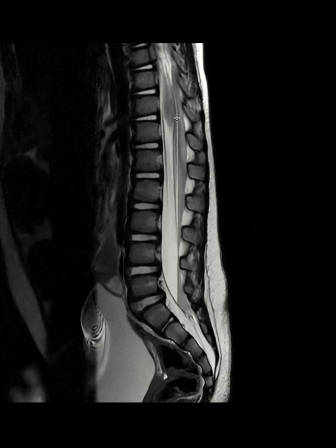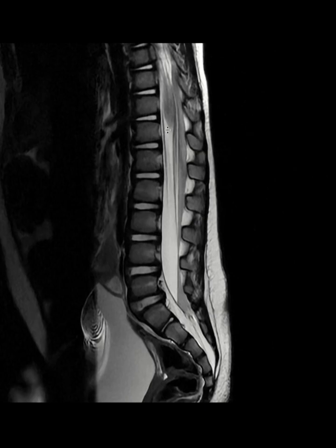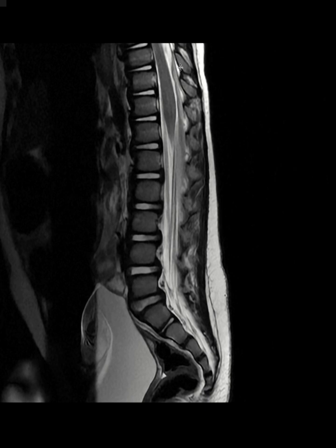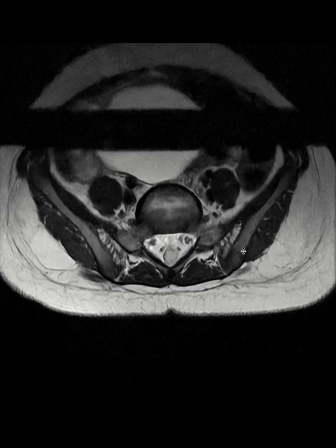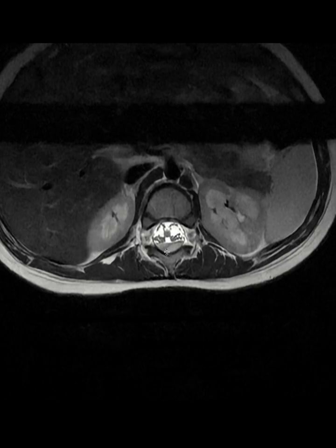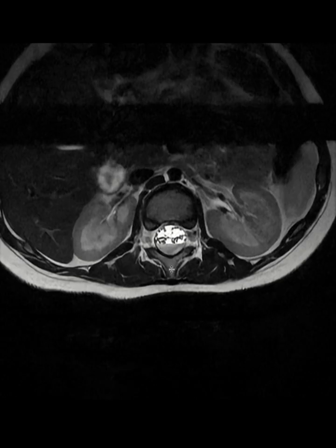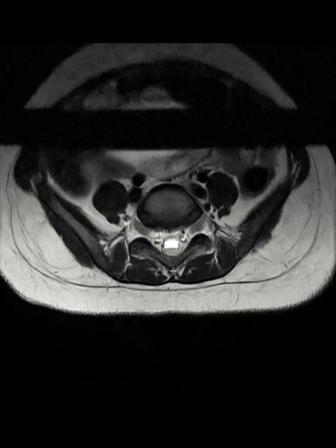So you see this area that we are seeing as the distal spinal cord, and this is the conus, and then we see this dorsal epidural collection showing right there, and then here we see some layering fluid in the distal thecal sac. Basically this is a subarachnoid hemorrhage. So if I go up here again, this is the conus, this is the epidural collection, and then all the way down you're going to see some areas of subarachnoid hemorrhage.